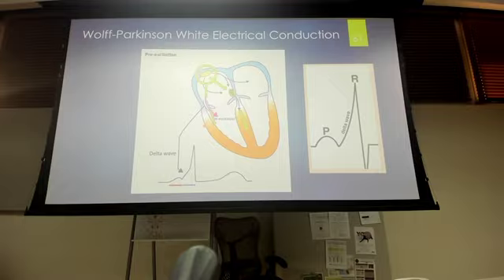Great. Now, some of these depolarizations are bypassing the AV node. What other part of our EKG complex is going to be affected? If it's bypassing the AV node, the PR interval, that PR segment, is going to be affected as well. So those are the two main areas that we're going to identify as abnormal on our EKG.